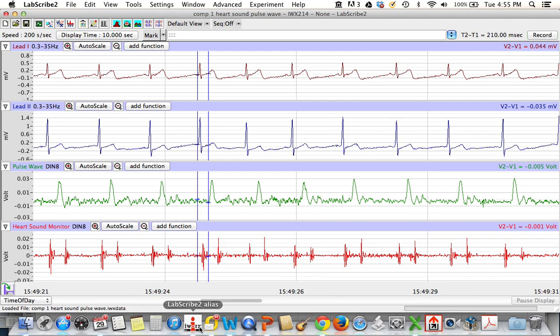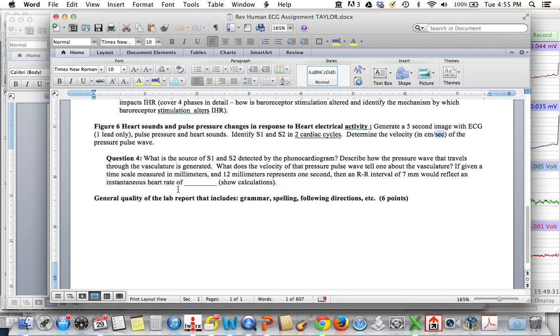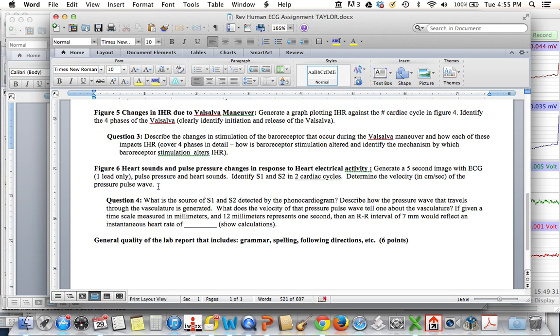All right, great. So now we've got that figure 6 lined up, and then we can go through and answer the questions here. So hopefully that'll help you navigate some of the questions that we have, or at least get you generating the figures for the report for the human ECG.